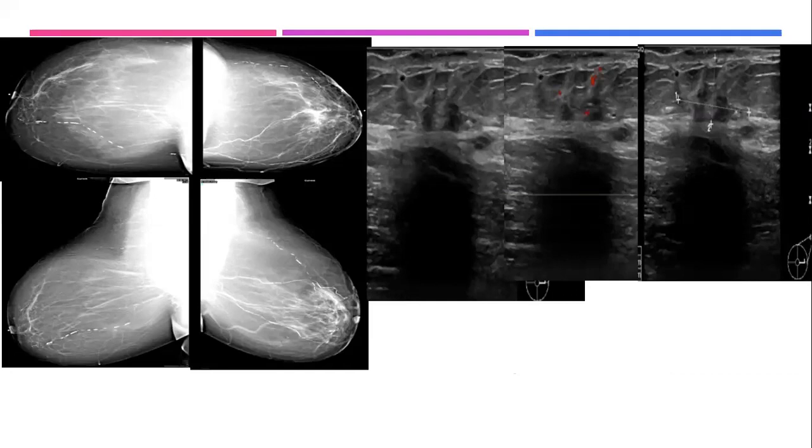This is the 3 o'clock. You see the site of the ulcer. This is the ulcer, and the dermal. It is only a very superficial ulcer. Okay, that is why they referred the patient to dermatology. There is no infiltrating mass of the underlying dermal layer.